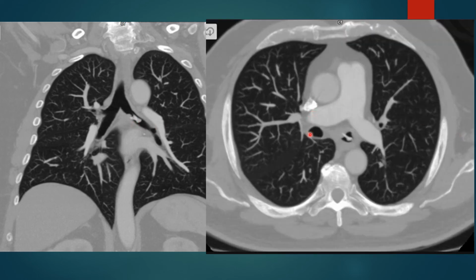This is an axial lung window, the same CT. You can appreciate the ascending and descending aorta, main pulmonary artery bifurcating into the right and left. You can see they also decrease in size moving laterally. I'm not really sure what this hyperdensity is. My guess is it's a calcification or a medical implant, because on CT, remember, chronic hemorrhage, edema, and air are hypodense, dark with those negative to low Hounsfield units.